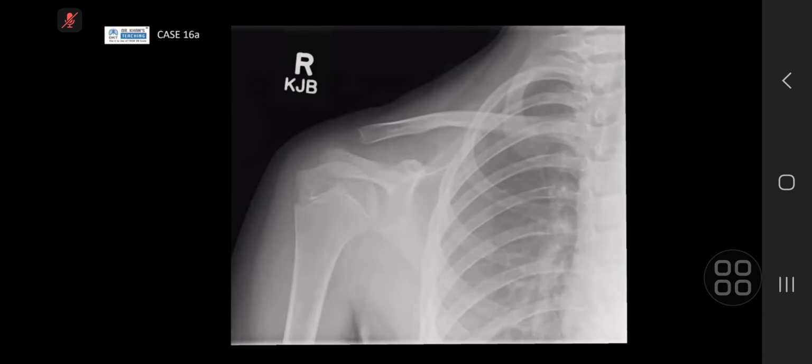Yeah, well done. So going back to the first one, you can see that there's actually expansion of the medial clavicle. You're right, there is no significant bony destruction, but what you have here is periosteal reaction along the medial edge, just underneath here, and possibly along the top. This is smooth periosteal reaction, suggesting this is a fairly chronic process. Because like Dr. Kapoor said earlier, when you have more aggressive periosteal reaction, the bone has not had time to lay down, so you get partial laying down of bone, and then with destruction, you get Codman's triangle. Can you imagine that the periosteum is trying to lay down, but part of it is just not, because it's being eaten away by whatever destructive process it is. So there's smooth periosteal reaction, bony expansion.